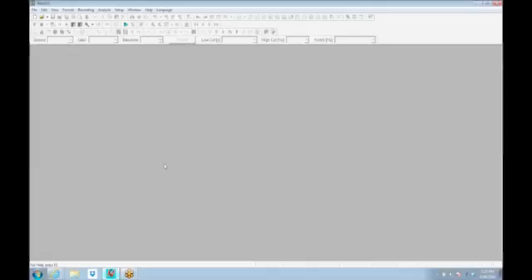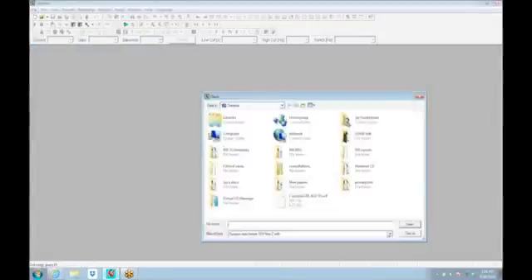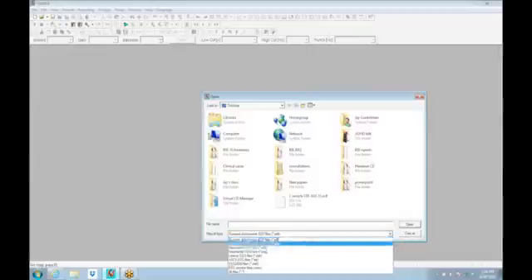Anyway, we've got a free software, which is downloadable. The software is called WinEEG, which is a Windows-based EEG product, and it allows us to process files. For those of you who have a dongle, you can import various files. The import function allows us to see a wide variety of types of files.